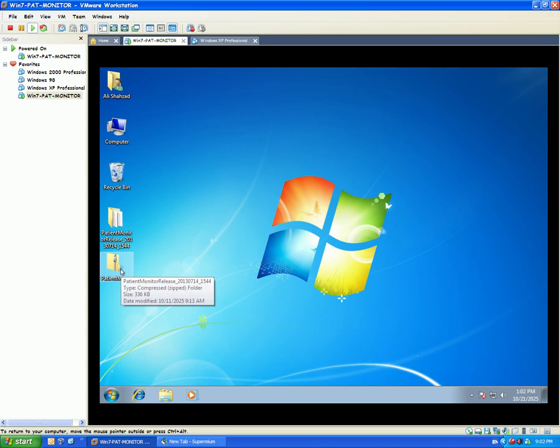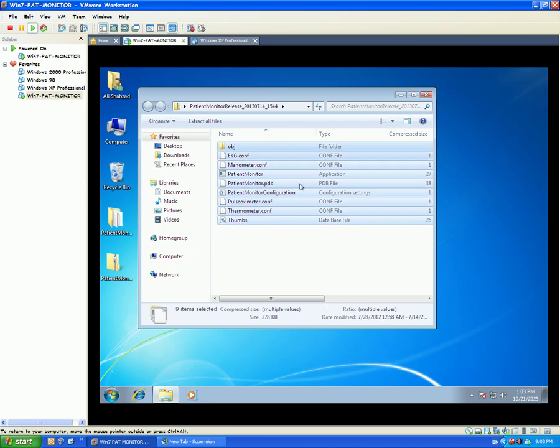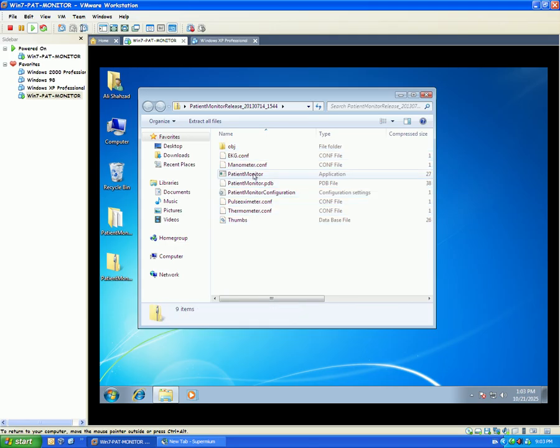When you open up this file folder, you will find these core components for the software to run, and they are crucial. These are all of the configuration files and other files, which are important, along with a simple exe file, which is the main software, which inputs data onto the software to run.